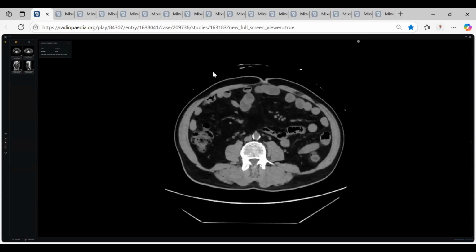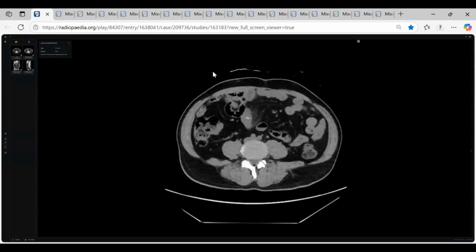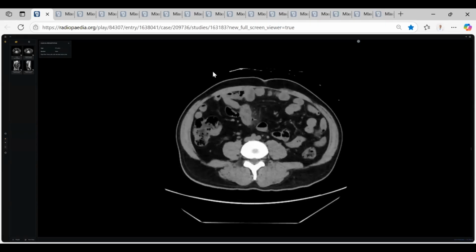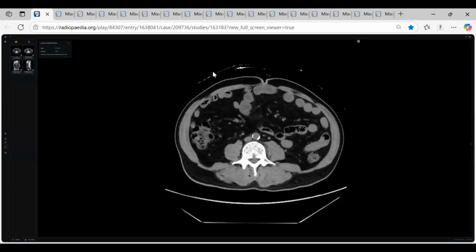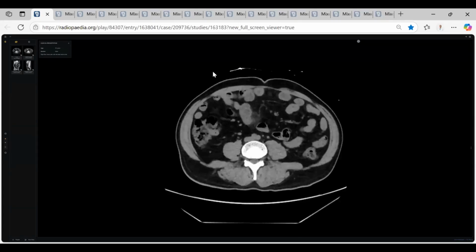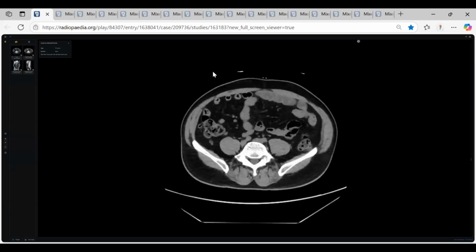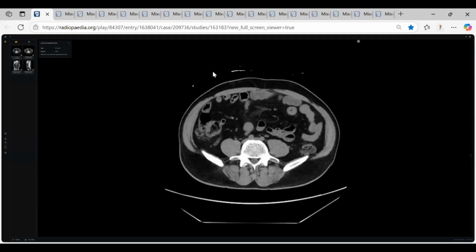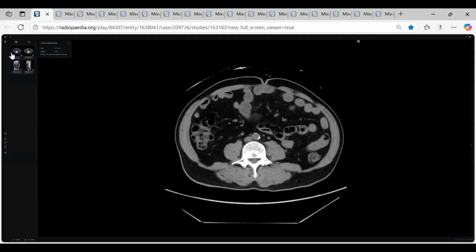Yes. There is specific density with fat stranding noted. Excellent. Where? Central mesentery. Yes, but where is this density? The fat stranding is in the central mesentery, but the density where? In the mesentery, with the linear hyperdensity noted associated with it. Okay.